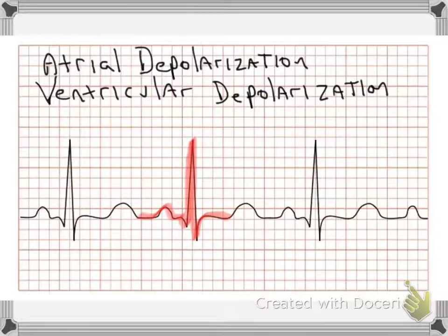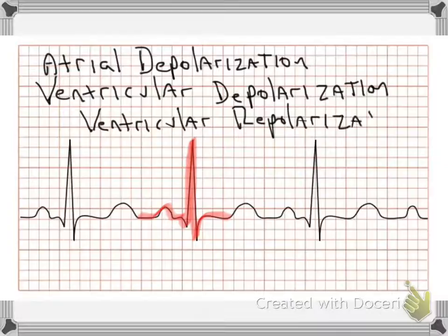Now, the ventricular depolarization takes longer because there's more mass of the cardiac myocytes than the atrial myocytes. The peak is also bigger because the ventricles are so big. And what you can know from an electrocardiogram is really the size of the tissue that's depolarizing. Now, how do we get back to rest after this long depolarization? And here we have the ventricular repolarization. This is the T wave, and I've got it labeled in green.